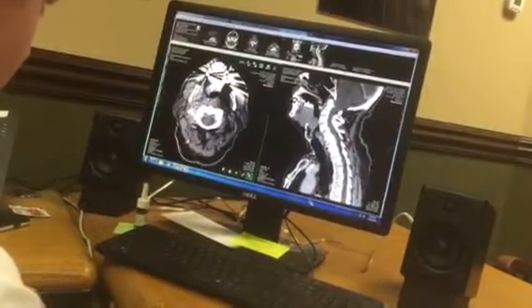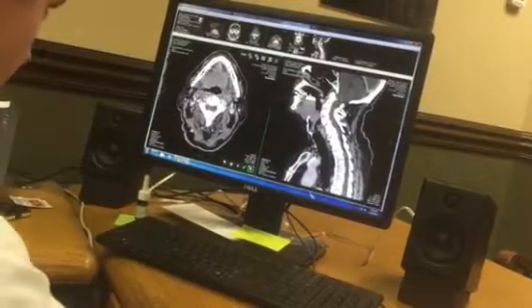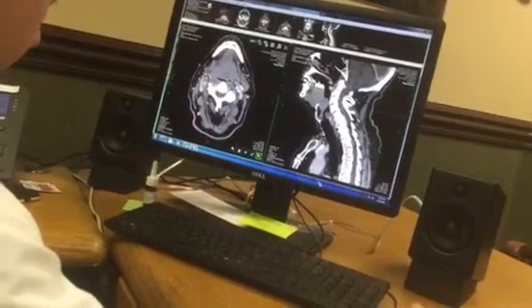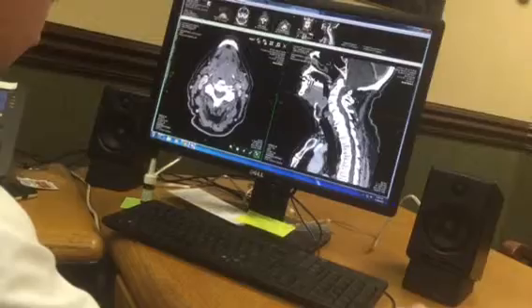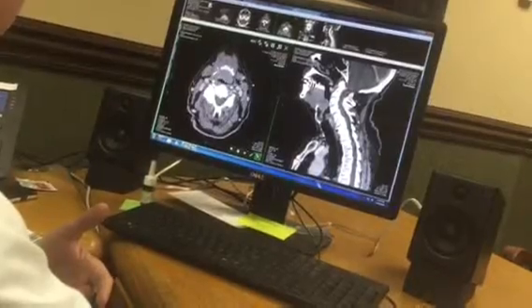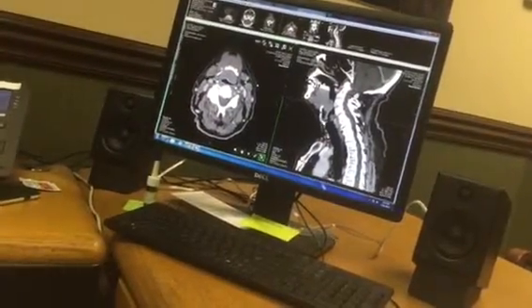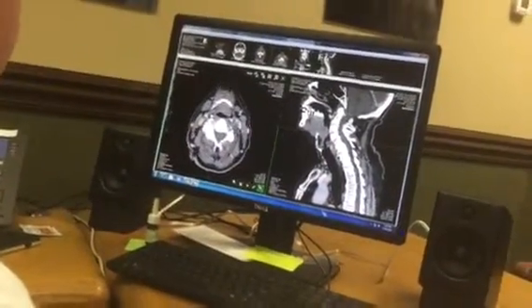So you don't see anything in the mouth or the dental artifact. As you scroll down, you see how this whole area is kind of indistinctly smudged out. See that? It's kind of weird. You can see how somebody might not be able to really pick up on this, but see that fullness, that area, that bump, that hump that I was showing you. I did just like that when I showed you.